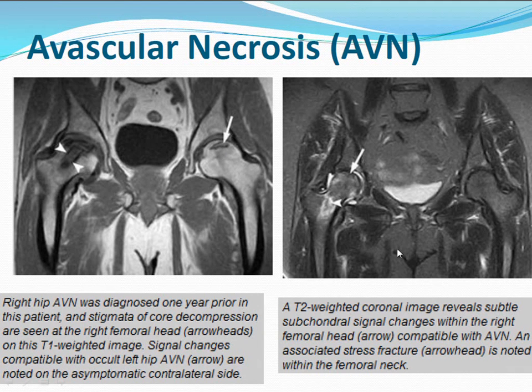This is one that's gone on to have a complication of a stress fracture in the femoral neck, so that of course would have to be surgically repaired. In this case, it's a pretty significant stress fracture where you see a lot of edema going through and through the femoral neck and really extending into the proximal femur. A little bit of a joint effusion goes along with it. This fluid signal intensity there.